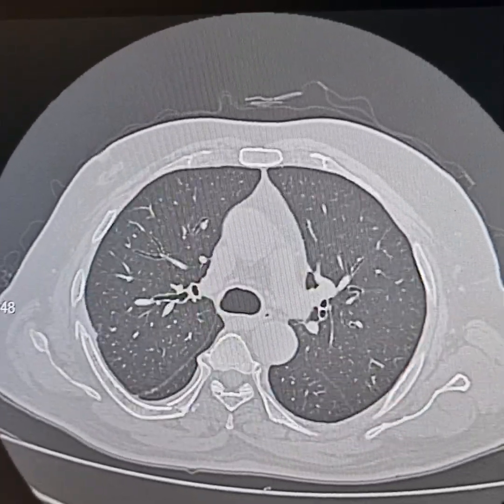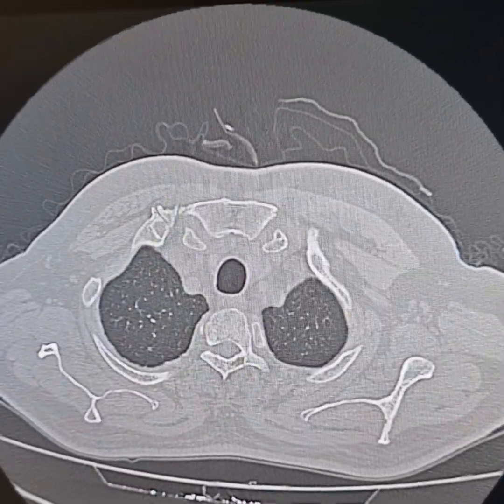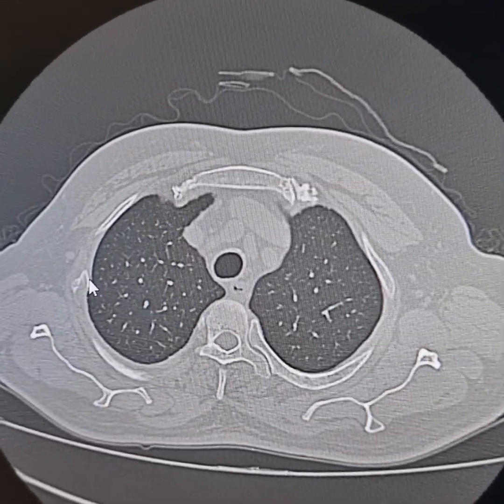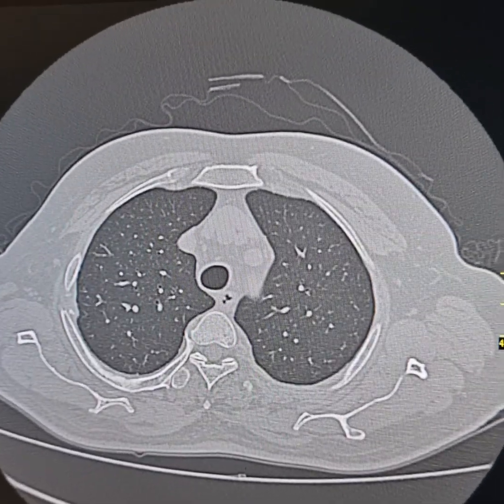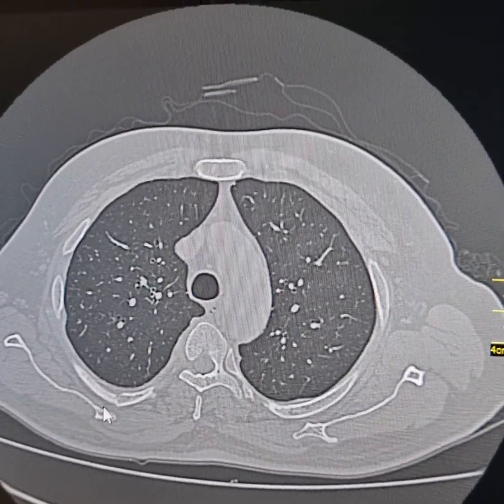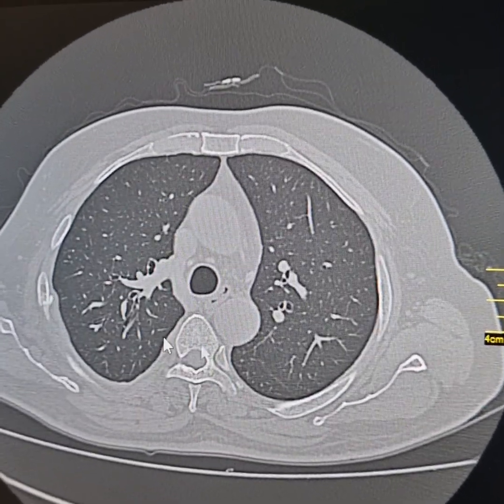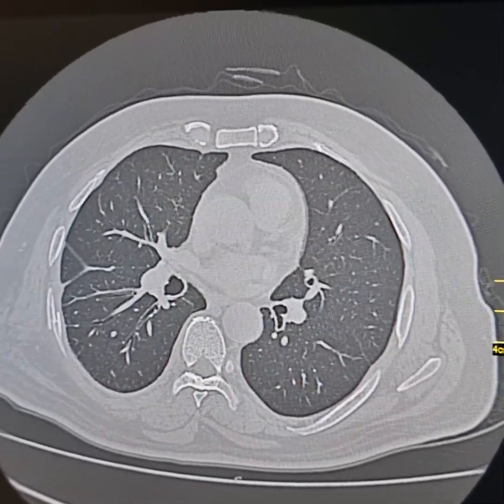Now there are multiple fractured ribs. They start from the right fourth rib. Now this is the fracture involving lateral part of right fourth rib. Now this is the right fifth rib. Its lateral part is fractured as well as there is fracture of the anterior part.